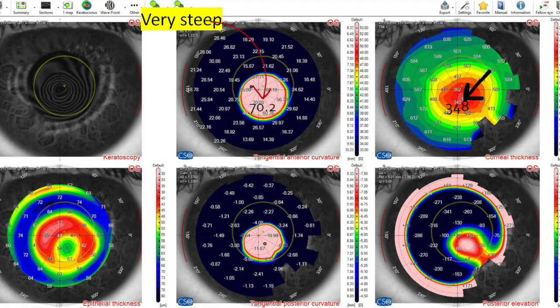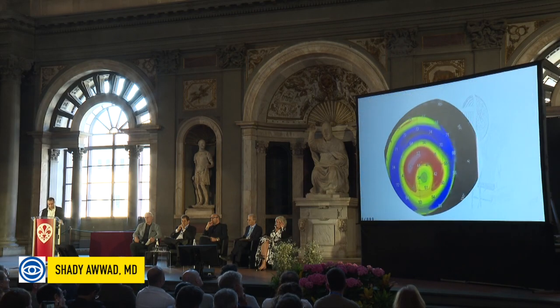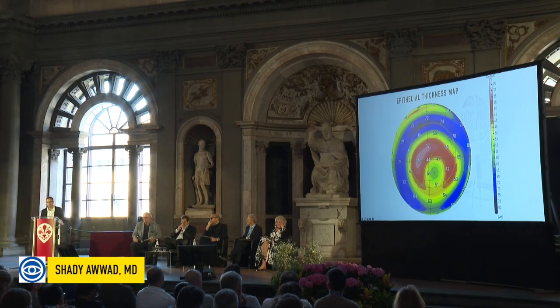So again, another one is OCT section. Always be skeptical of your data, even if your machine is amazing, because with this patient with very advanced keratoconus, the MS39 shows 54 microns in here. But if this is so far off, don't trust segmentation. Segmentation is based on AI, and don't trust AI when you are at the periphery of your spectrum, because you don't have enough training data for this.